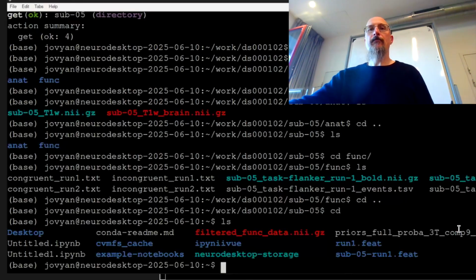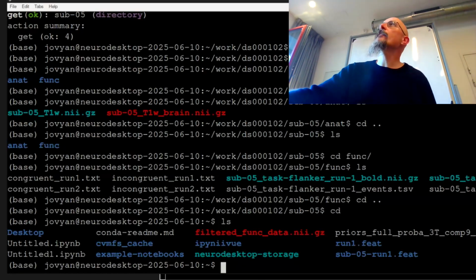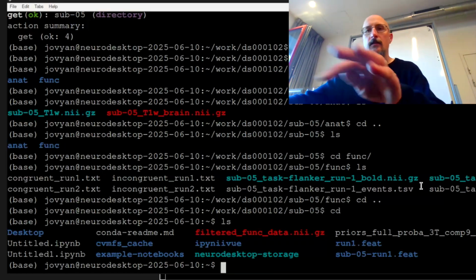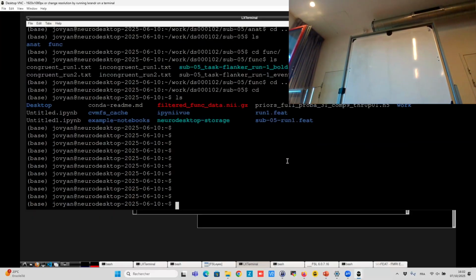Yeah. So there are several ones. If you press go several times, you will create several. Let me just show you. In the home directory, I have one here, but the one I just ran is this one. If you press go several times, you will get a little plus in front or at the back of the folder saying this is a second folder. And if you press again, you get 2 plus.